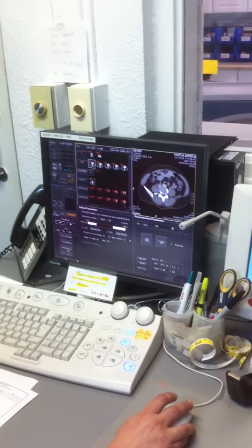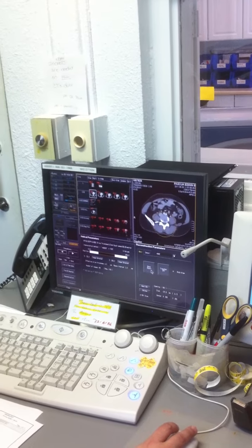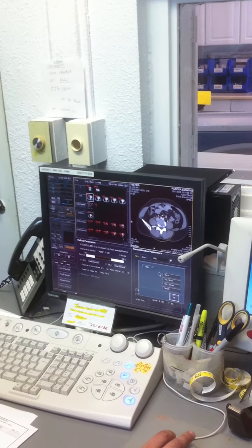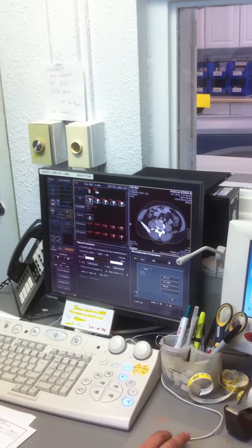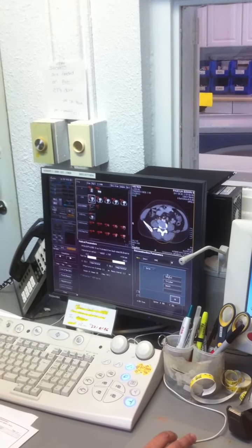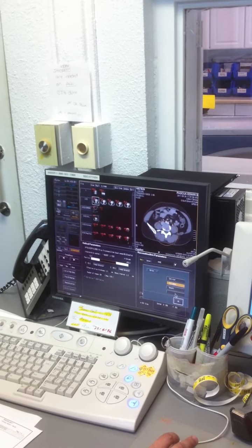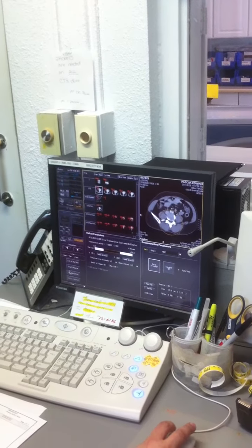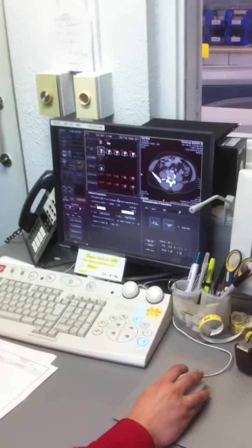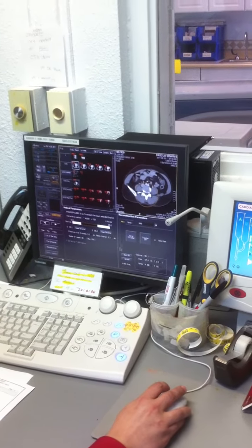So you have to do a soft tissue then a bone. Exactly, I would do them ahead of time too. So you would just change this, or I'm sorry, you can actually do this. I don't know if you guys knew this or not, but this spine is actually soft tissue, not bone. So I would use spine, thoracolumbar, reconstruct. Any other questions about raw data?